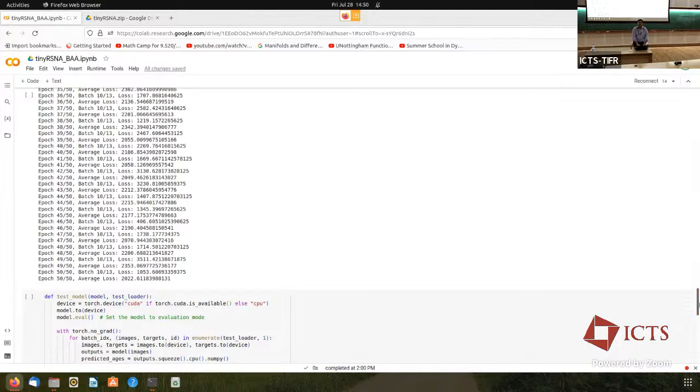But the moment it passed through the network, the loss goes up, right? My loss was just initialized to 0, but when I computed the loss in my first pass, it went up. Well, it's just an initialization. I could set it to 5,000. It'll come down. It's just an initial number. It's a cumulative loss, so I set it to 0. And as it went through the epoch, it started picking up loss, so it went up.